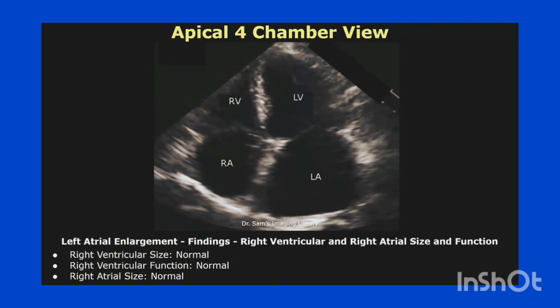The right ventricular size is normal. The right ventricular function is normal, and the right atrial size is also normal.